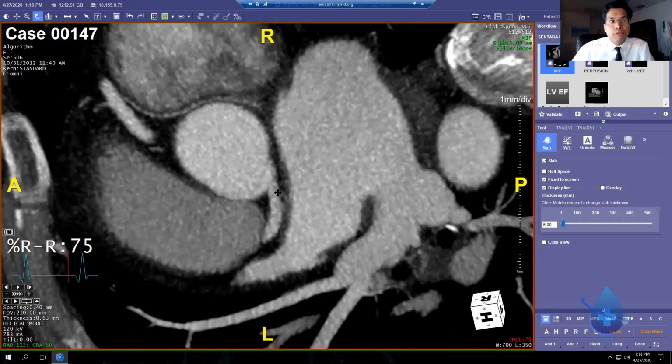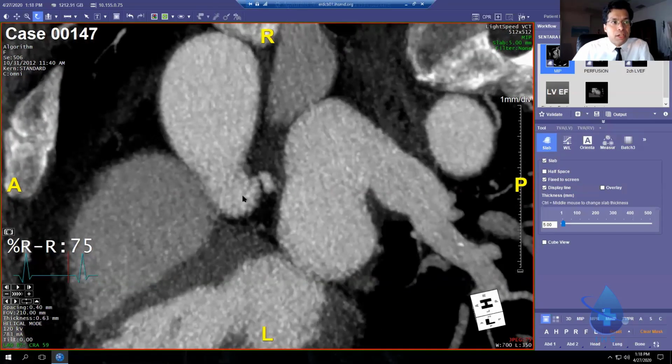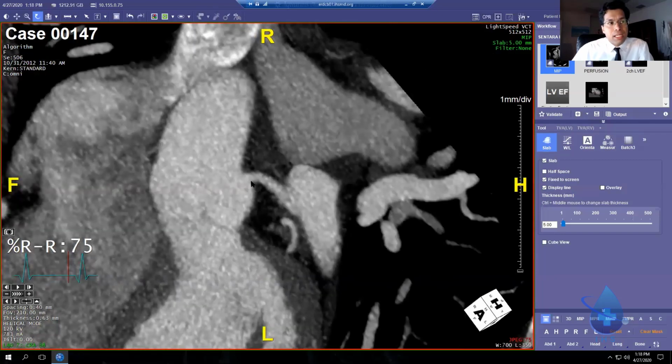If this looks abnormal to you, then you're probably a good cardiologist, because I remember 15 years ago looking at this saying, you got to be kidding me. This looks like the most diabetic, diffusely diseased LAD I've ever seen. And that's because it's slightly pixelated. But this is as good as it's going to get in 2020. This is an outstanding quality cardiac CT.